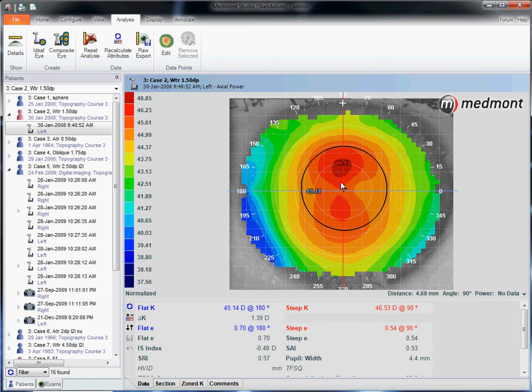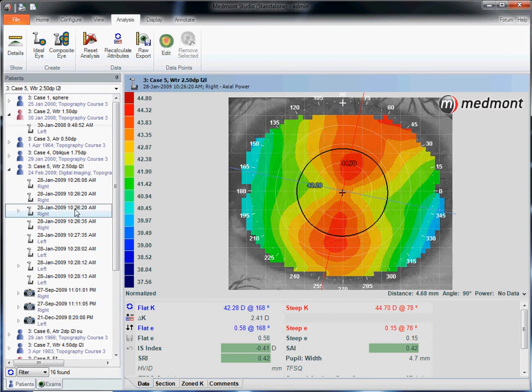Let's take another patient, remembering that the previous patient has this confined apical astigmatism. When we compare that to this patient, we see now an astigmatism that runs from one side of the eye to the other. That hourglass is very much limbus to limbus in diameter. The limbus to limbus corneal astigmat is much tougher in orthokeratology because the peripheral corneal shape is more astigmatic. That's more challenging from a fitting perspective or an alignment perspective. Centrally, to push the astigmatism out of the way in a limbus to limbus corneal astigmatism is tougher.